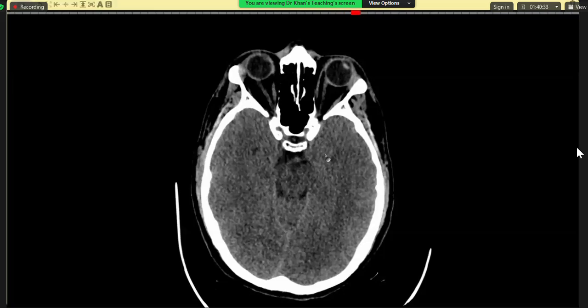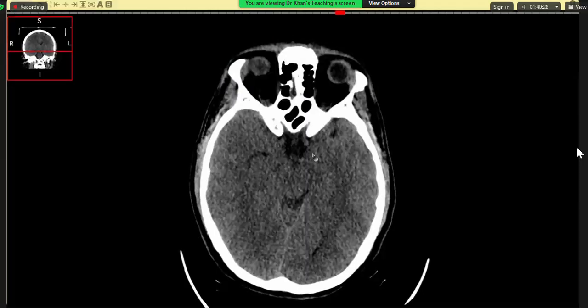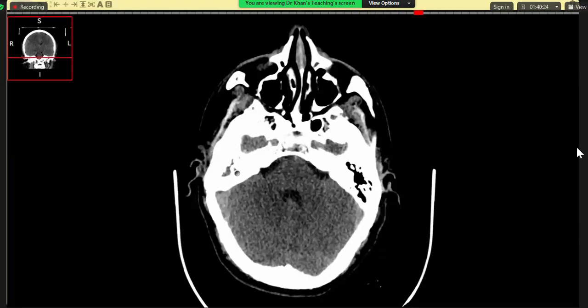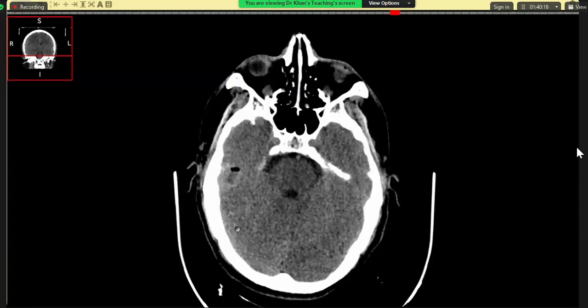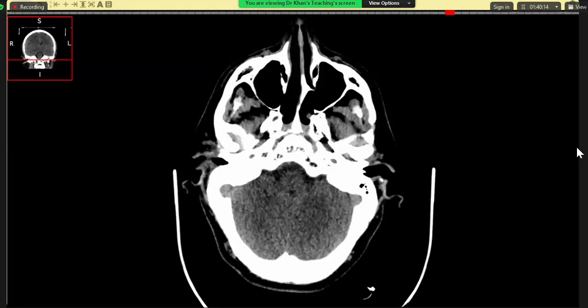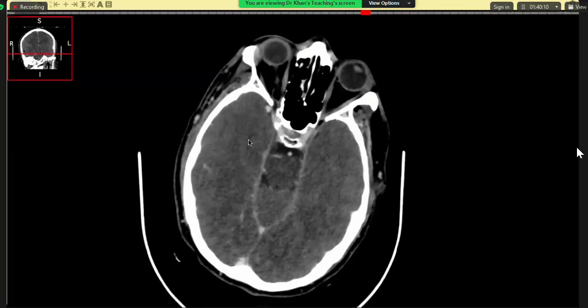I'm here, sir. Okay, so that was an overcall, because of asymmetry. Otherwise, you did pick up the findings very well. But then you overcalled it. You said that there is high density here, in keeping with, you were absolutely sure. You cannot be sure. You ask for contrast. And on contrast, this is the contrast.